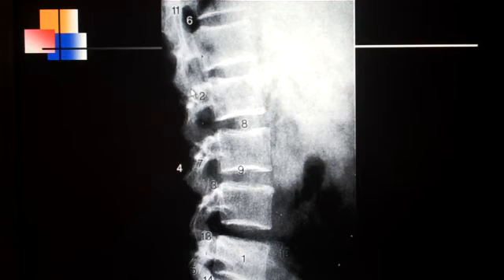If I go up to this segment, you see there is the apophyseal joint. Number 4 is on the spinous process. Now it's a little bit further back on this film, and so it really is on the spinous. Number 5 is on the inferior articular process of the last lumbar, and again, here is your apophyseal joint right there between 5 and 14. The sacrum does have a superior articular process, and that is number 14 on this film. The superior anterior aspect of S1 is called the sacral promontory.